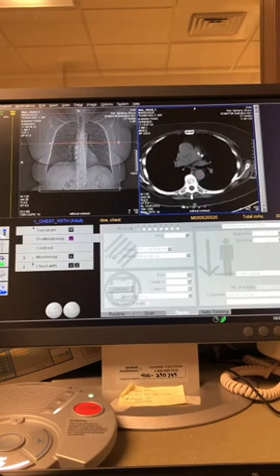This is our pulmonary trunk, and that's one of the branches, the right pulmonary branch, and the left one looks like it might be inferior to this, and it's going to swing down this way. If we could scroll through, we'd see it. I'll show you when we look at the actual scan. Then inferior to the trunk, we're going to see pulmonary veins coming in. We can see the bronchi bifurcation here, right? The primary bronchi here and here, and you can start to see some of it here.